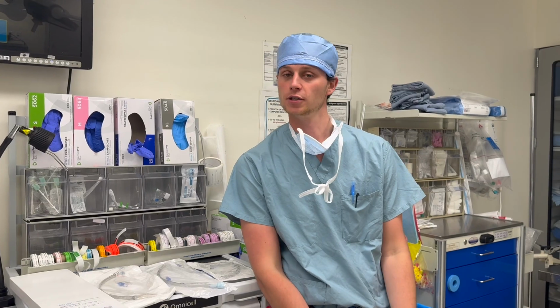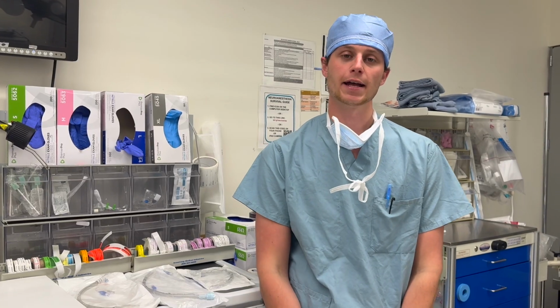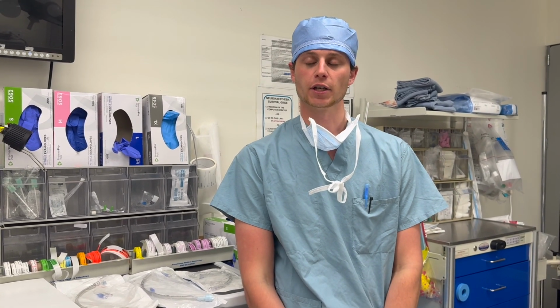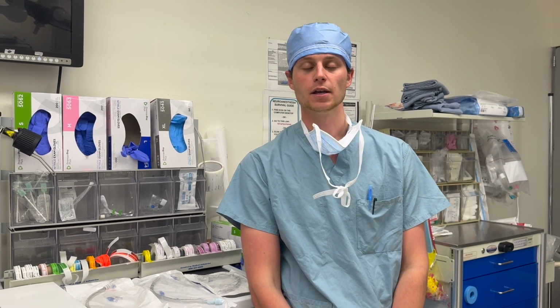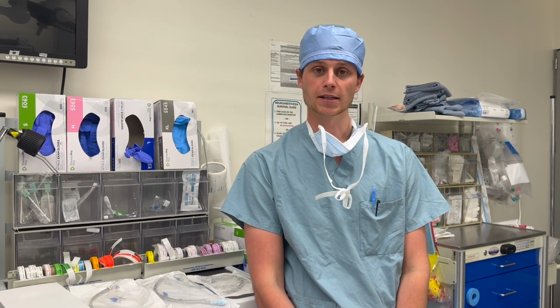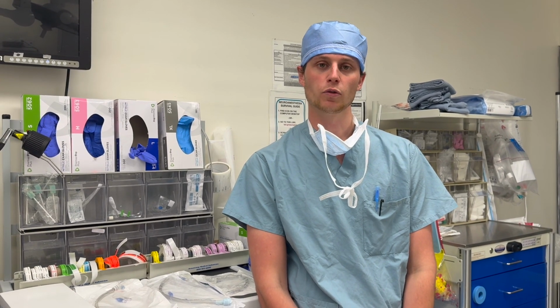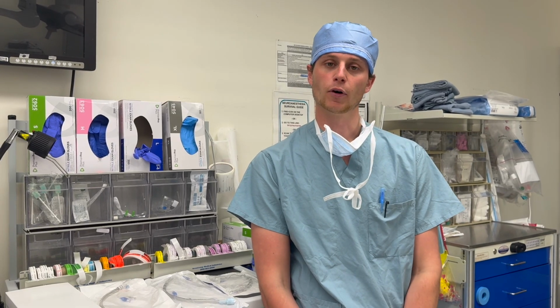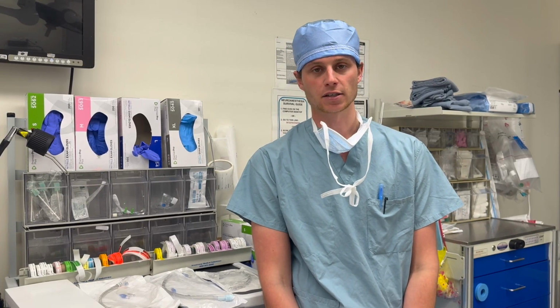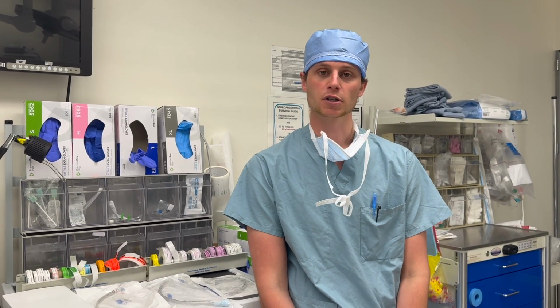One type of airway that I wanted to show you that we do not have in our workroom is a NIMS tube. A NIMS tube is an endotracheal tube that has wires in it to monitor nerve function within the tube itself. It's typically used to monitor the recurrent laryngeal nerve at the vocal cords. You'll use it often in neck dissections or thyroid surgeries, and when you place it with a GlideScope, the ENT surgeon usually tells you how far to advance it so that the electrodes end up exactly at the vocal cords and are going to do adequate monitoring. So if you're doing neck surgeries or thyroid surgeries, be sure to ask the OR nurses if they're going to use a NIMS tube so they can grab it for you so you're prepared in the morning.